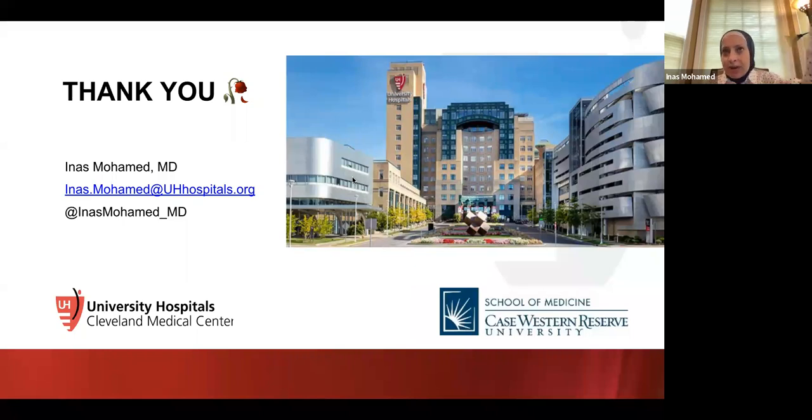When I'm describing it, I say there is an arterially enhancing lesion with washout, of course with the measurement. There is washout on the portovenous phase. This thing looks slightly hyperintense on T2, hypointense on T1. There is diffusion restriction, all this stuff. But in my impression, I would say LIRADS 5, let's say 3 centimeter LIRADS 5 in segment 2 of the liver, done. We all understand what I'm talking about. It's just a common language between all of us.